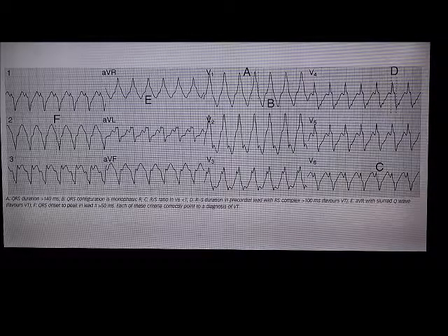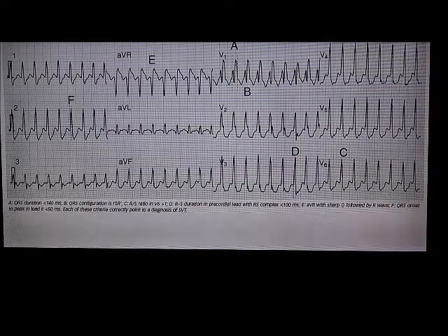So what's AVR? Positive. What's the axis? Northwest. Just these two help you say that this is most likely VT, and then you can go ahead and test it. Look at the bundle branch block. Is it typical? Give adenosine and see what you see, and then you can go ahead from there.